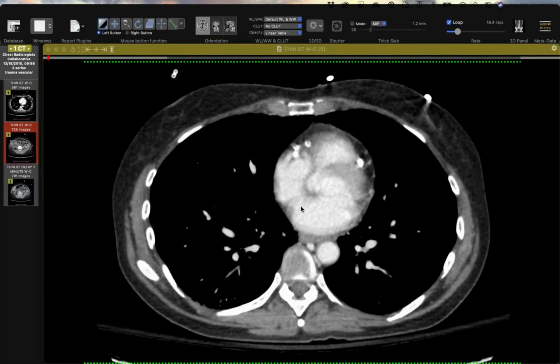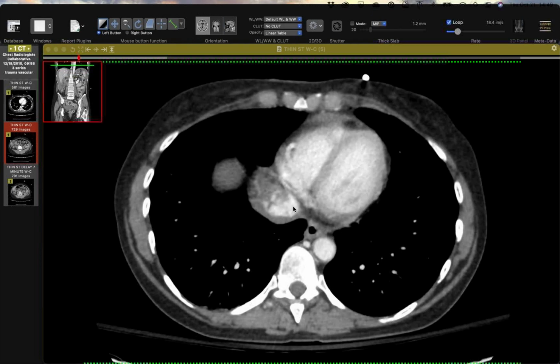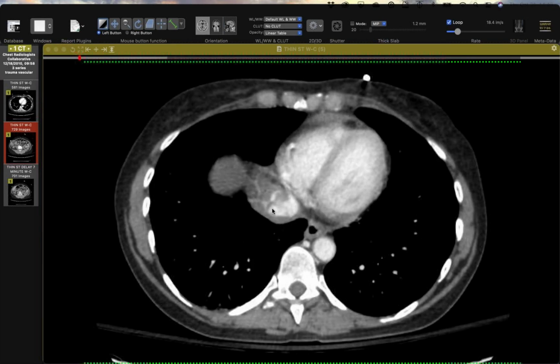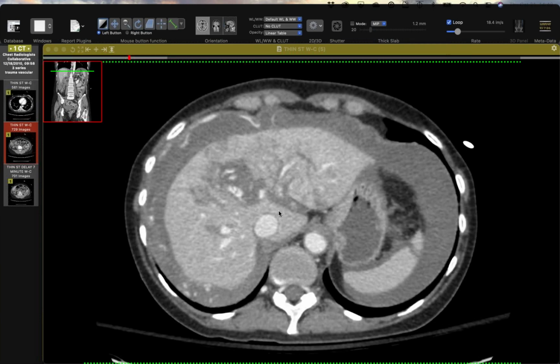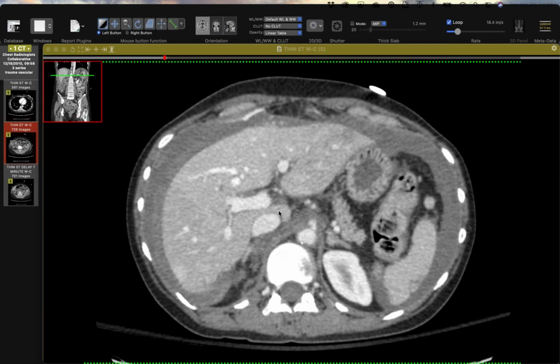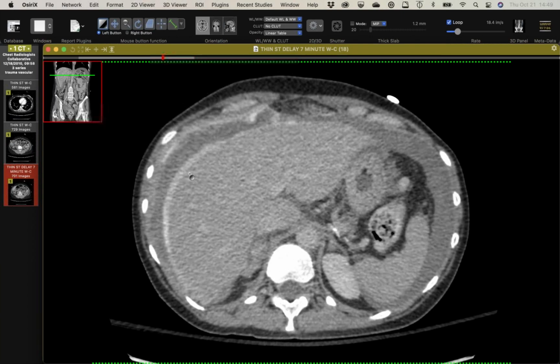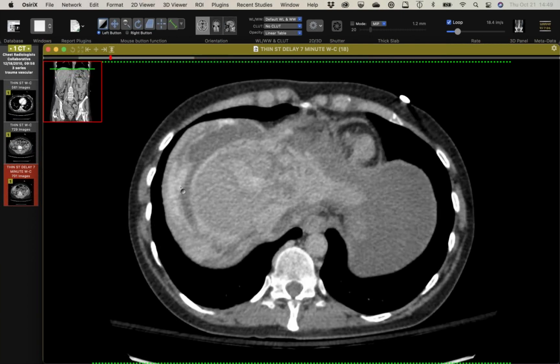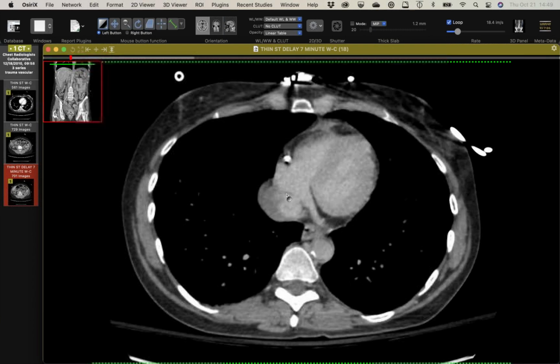Okay, so Travis, this is my avulsed IVC case. This was a bad motorcycle or motor vehicle crash or something, like high-speed trauma. And you can see it on the abdomen CT right in the same location. There's this unhappy looking IVC and very unhappy looking liver, probably the hepatic veins are avulsed as well, lots of blood in the belly. Interesting on the delays, there's all this subcapsular blood, and there's active bleeding into the peritoneum, and you can see there's the abnormal IVC.